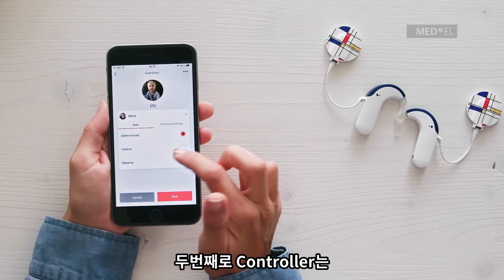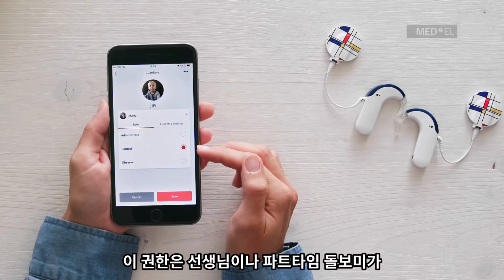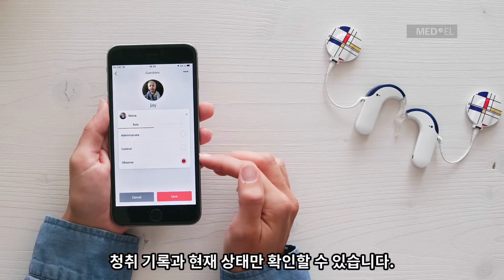If you have the Control Guardian role, you can change the user's listening settings and view their hearing stats. If you're a teacher or part-time caregiver and regularly need to change settings on a user's audio processor, this is the role for you.